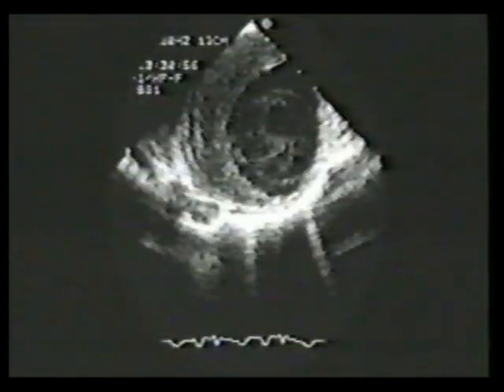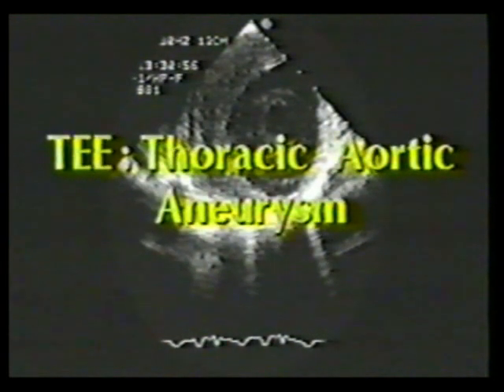This patient expired, and at autopsy, this linear structure was found to be a pseudomembrane that had formed over the surface of the thrombus within the fusiform aneurysm. These pseudomembranes can masquerade as intimal flaps and lead to an incorrect diagnosis of aortic dissection. The preceding study was performed in 1983.